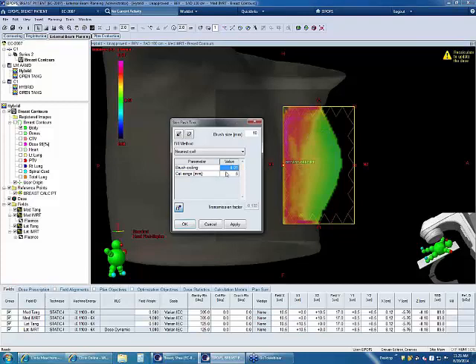So in this brush ceiling value, if I put in 0.103 and a cut range of 1 millimeter, what the system will do for me, instead of having to average out those values, is it will go in and it will sample the Fluence in here based on my brush. It won't go over this brush ceiling, but based on my brush, it will sample the existing Fluence and look at a cell 1 millimeter from beyond the diameter of the brush and extend the existing Fluence out into the periphery of the field.